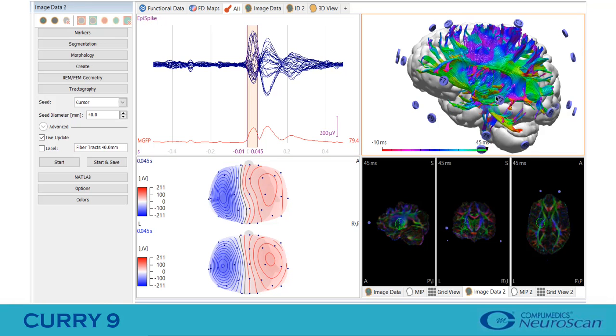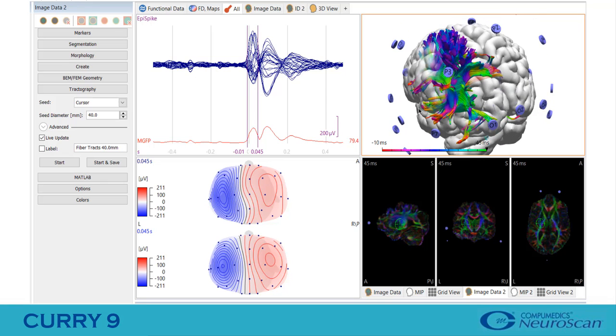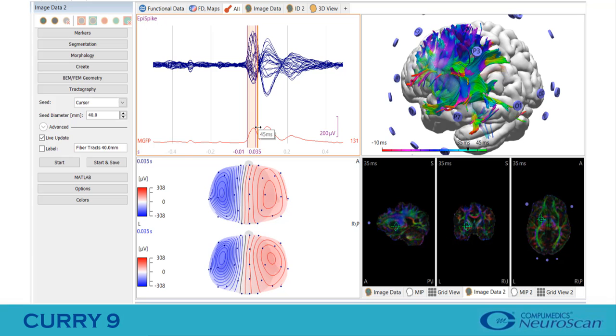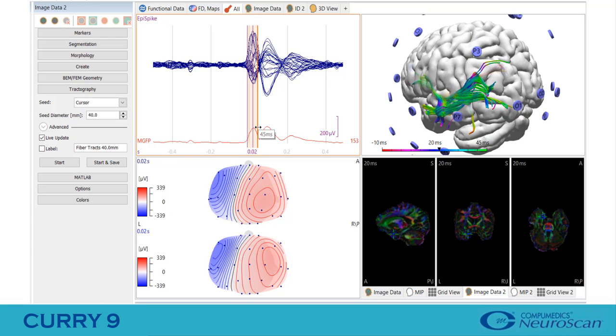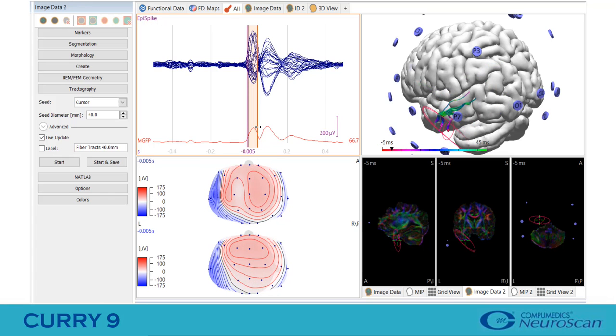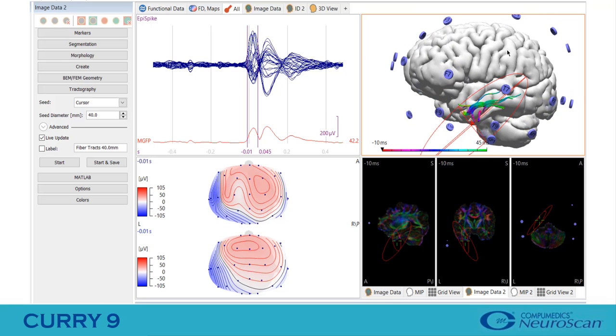What this provides us with is a view of areas of the brain that potentially could be impacted by the location of the propagated epileptic activity. And we can see how this activity, which starts in the tip of the temporal lobe, could start to explain some of the symptoms that occur as the spike propagates. Again, this is an interictal spike.